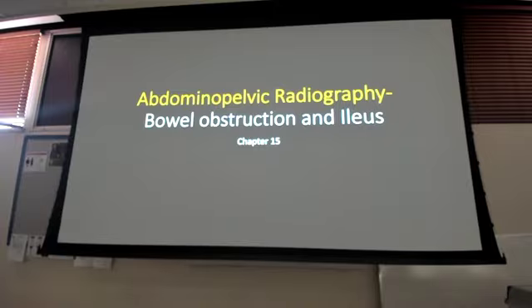Okay. Fasten your seatbelts for this section, because a lot of these pictures are going to start looking the same. If they haven't yet, they probably have, they're about to. And there are things in this next section between both large and small bowel via patient history and physical exam findings and things like that that will help you distinguish between bowel obstruction or bowel ileus, because they're going to be very similar, okay?